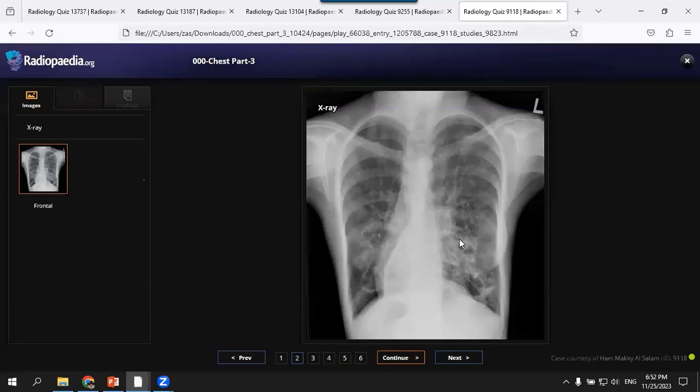There are also bronchiectatic changes affecting both lower lung zones. This seems like a young patient, and there are also signs of volume loss. So I'm thinking of Kartagener syndrome, or primary ciliary dyskinesia. Dextrocardia and situs inversus, and you mentioned the rest of Kartagener syndrome.